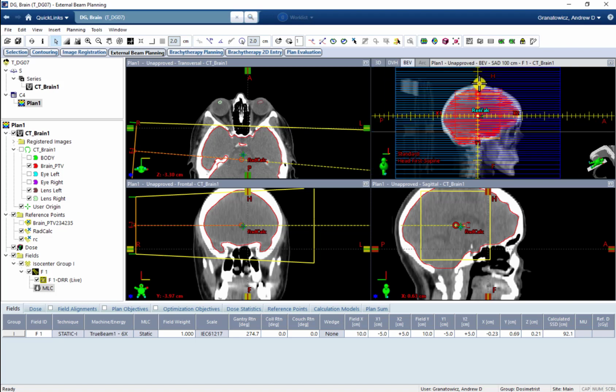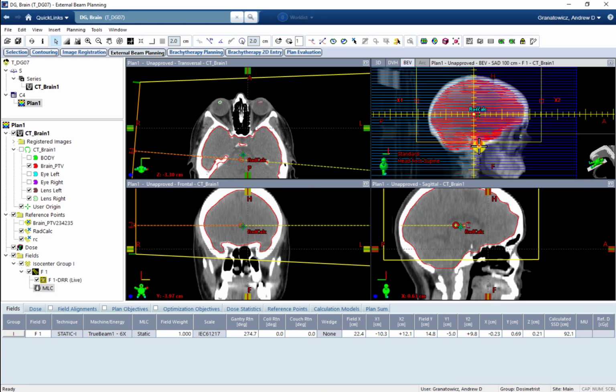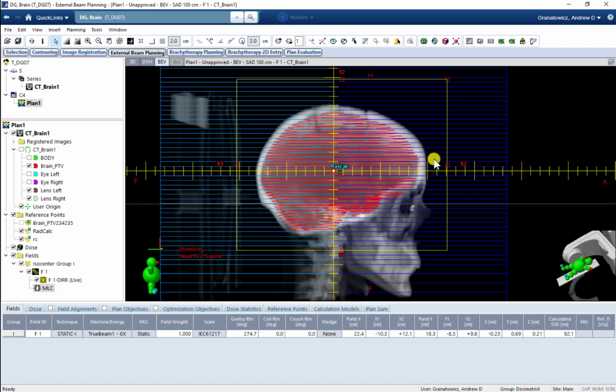Okay, so you're going to want to have about 2 cm of flash above the skull, behind the skull, and in front of the skull. And the bottom border on a traditional whole brain, you're going to want to put between C1 and C2. So if you look here, you can see C1 and C2. Usually you can really see that posterior process back here. You want to put it right in between C1 and C2. Okay, so something like that.